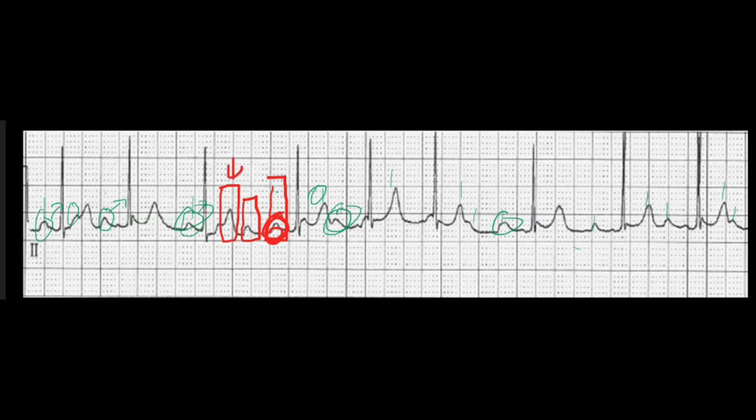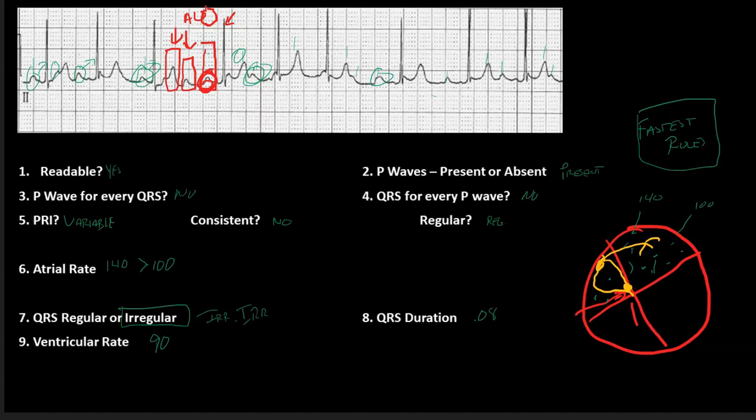So it does make a difference here. This T wave was here. This one here is telling me that this AV junction probably stopped it. So there's our nice little stop sign, right? So if it stopped it, then it allowed the next one to go down, which is why you get this QRS complex there. Okay, so this is coming from multiple locations up in the atria. This is a multifocal atrial tachycardia. Okay, all right.